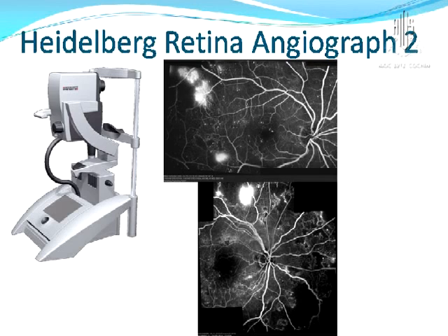These are the images of the HRA. You can see the clarity, you can make out all the structures. You can see the FAZ, you can find all the retinal vascular abnormalities, you can see CNP areas. It's got an excellent image. However, it's the most expensive.